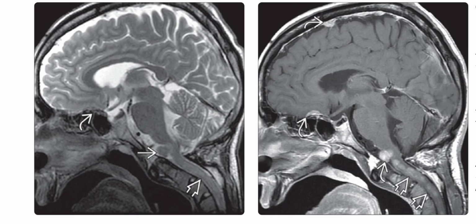The left is the sagittal T2-weighted fat-suppressed MRI of the brain and the upper cervical spine, and it shows blistering of the planum sphenoidale, an extra-axial mass in front of the medulla at the foramen magnum, and an enlarged hyperintense cervical spinal cord. The right is the sagittal T1-weighted contrast-enhanced MRI in the same patient, and it shows multiple enhancing meningiomas and enhancing ependymoma of the upper cervical cord. A swan neck deformity is noted in the upper neck from prior multi-level laminectomies.